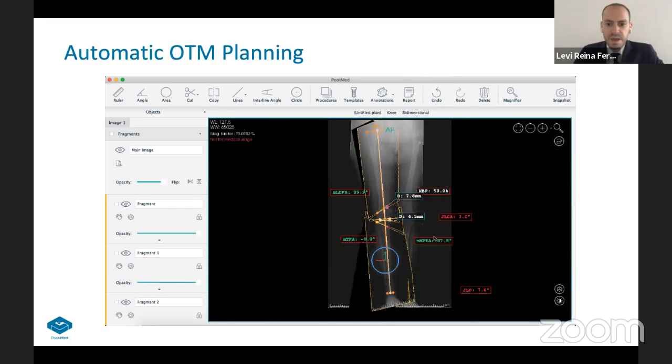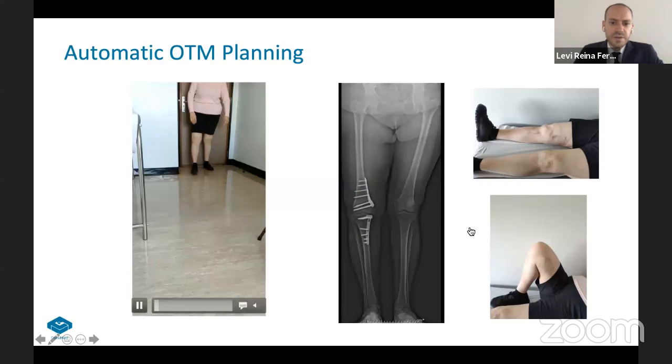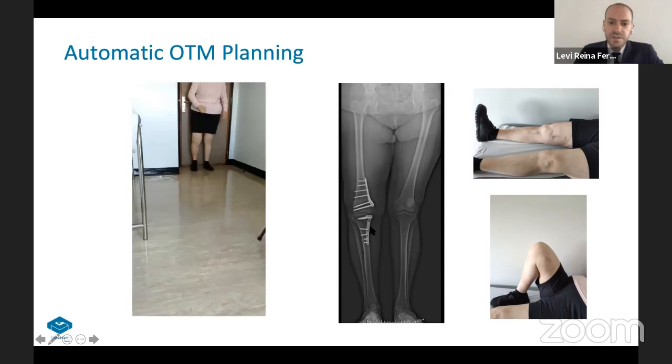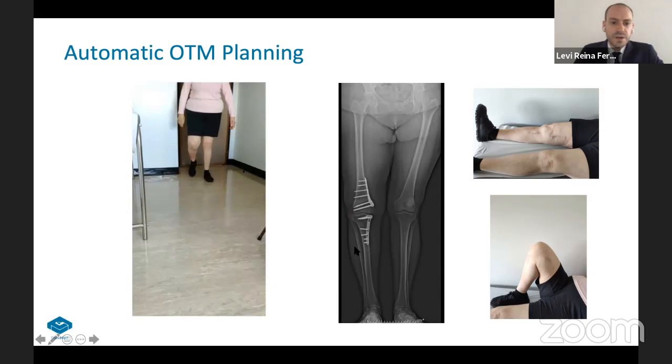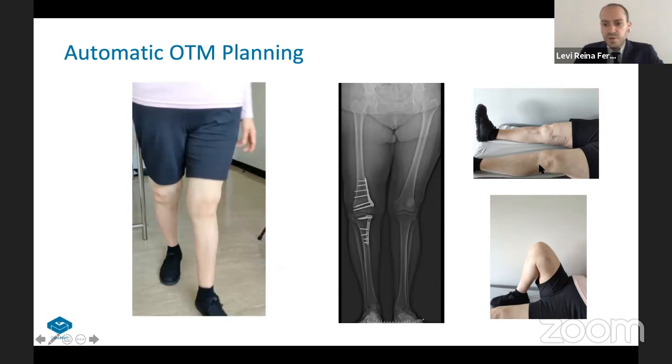take from the tibia. So actually, when I did this osteotomy, I didn't take the joint line congruency angle into account, because this was previous to these new concepts that we've been studying. As you can see in the result, the knee is corrected, but it's a little bit in slight varus. This is because the tibia is a little bit varus, and we ended up not being able to put the D-screw. But since this is a biplanar closing wedge, it healed very, very good. So she's 6 months here with a good range of motion and very happy.